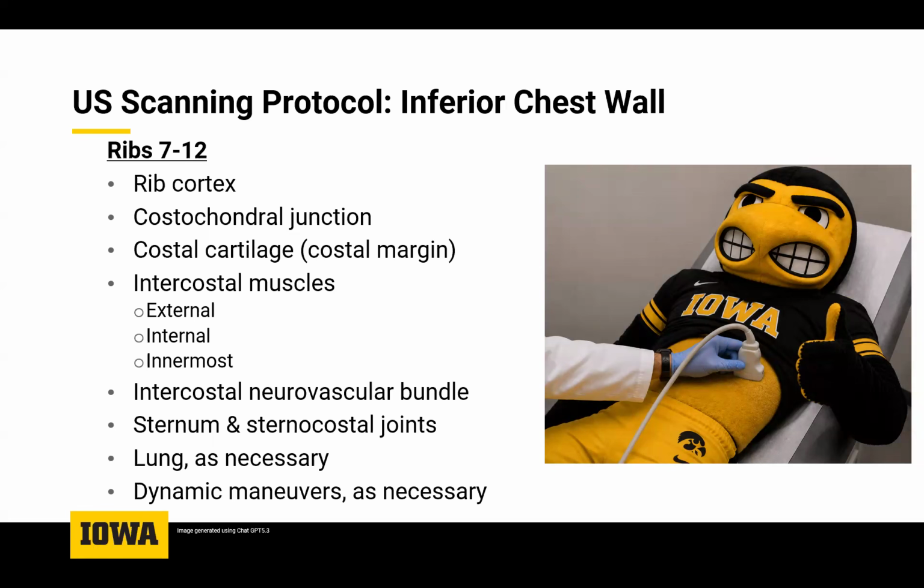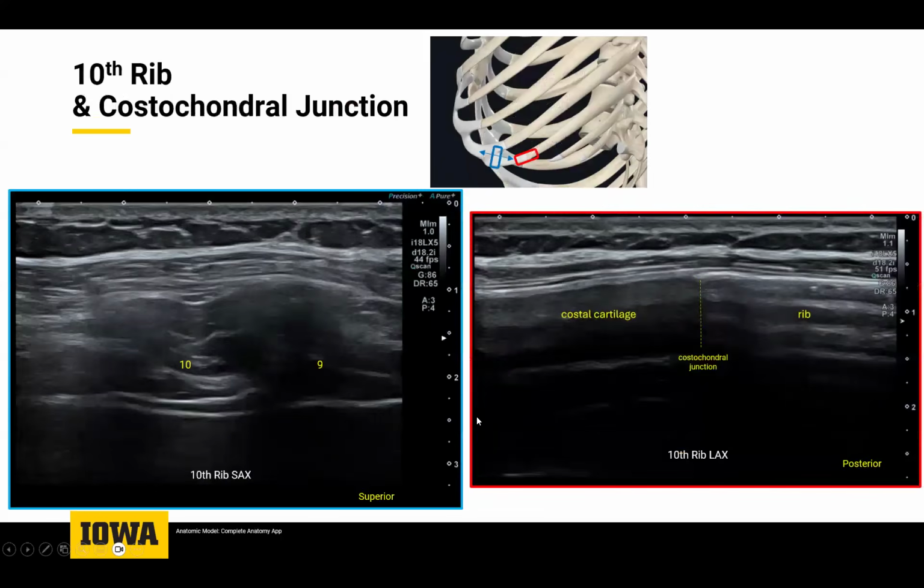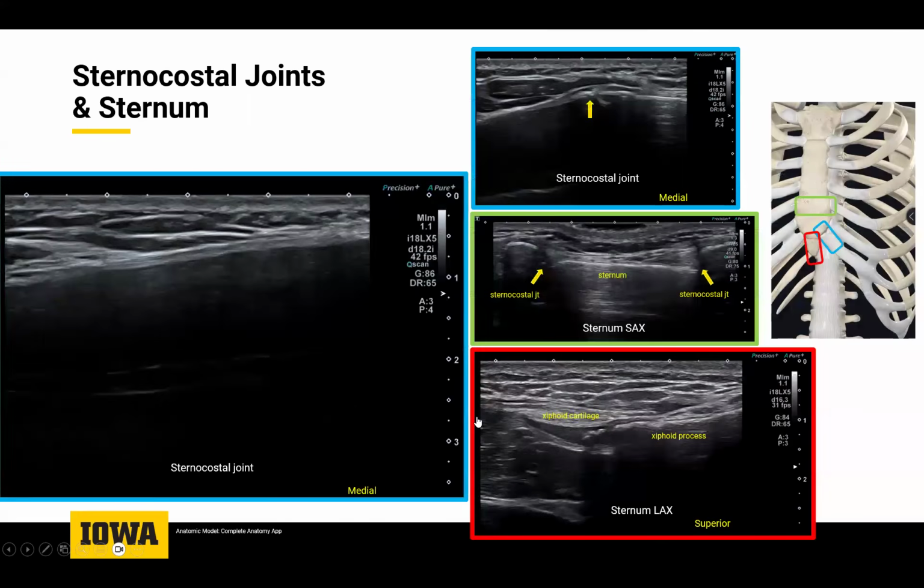With the xiphoid process, ultrasound can see the variability in morphology. I've seen bursopathies here. I've seen pain just from, let's say, an inverted xiphoid process. And then something that we get pretty frequently too is sternoclavicular joint non-traumatic pain. We see this a lot where people in their 70s or 80s will just wake up one morning and they'll have a swelling and pain over the SC joint. It's a hard area to image, but with radiographs and with ultrasound, you can see right away. And most of these are just capsular hypertrophy from osteoarthrosis, and why it one day becomes swollen and painful is a bit of a mystery.